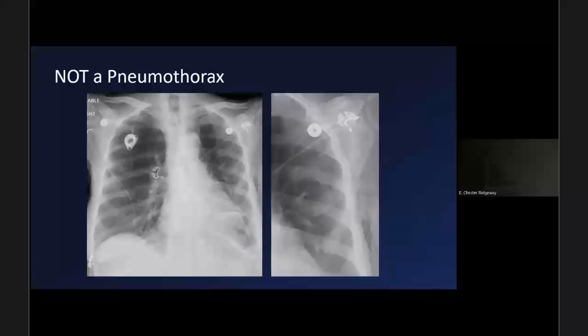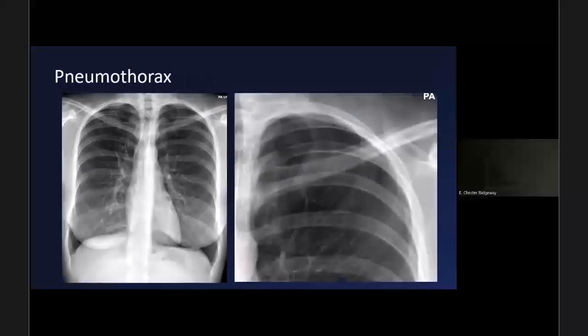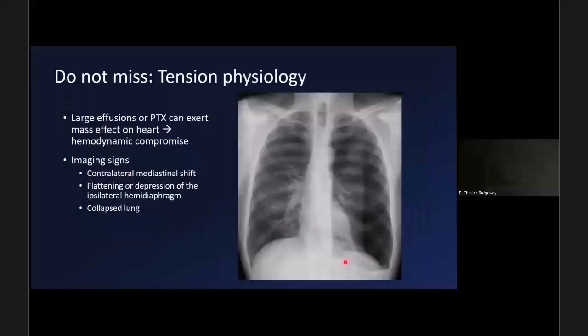This is not a pneumothorax. On the left here, we have these dark lines. This is a skin fold. This is a pneumothorax. Still on the left. Again, parenchymal markings where the lung is. No parenchymal markings outside of it. Nice, thin, white line. Now, this one is trickier to see, I will admit, but there is still a thin, white line. This is a pneumothorax.